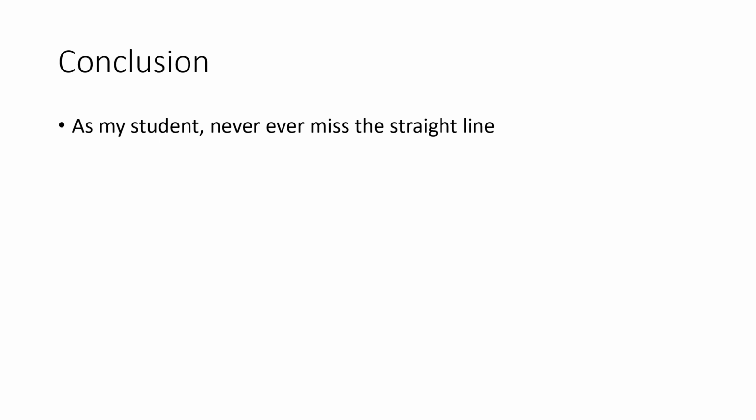So that's it. Now the main thing is, as my student, never miss the straight line in an X-ray. I have given you multiple X-rays. I have shown you the straight line. I have given you the differential diagnosis, what could be a straight line but is a different diagnosis. We saw all those things.